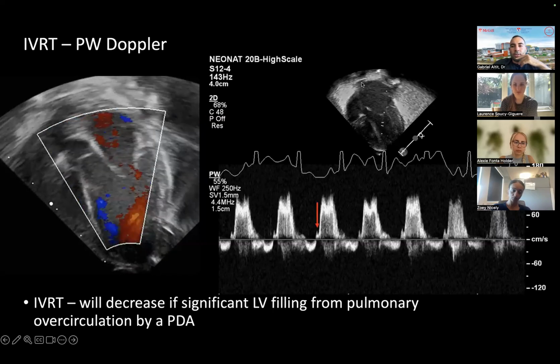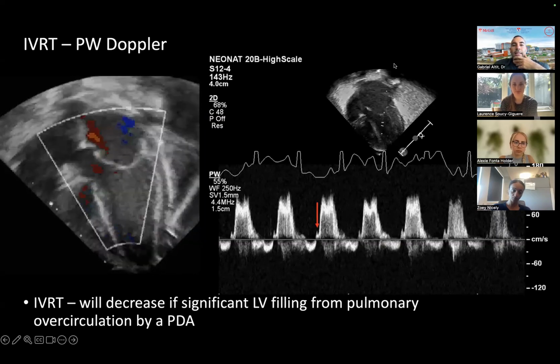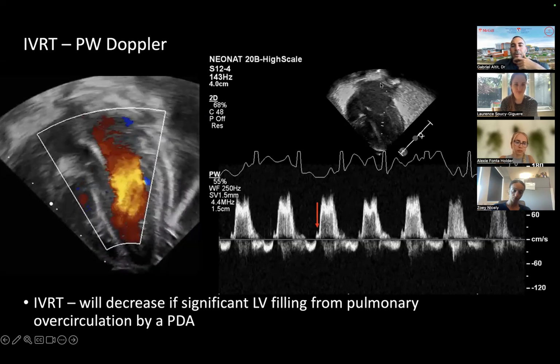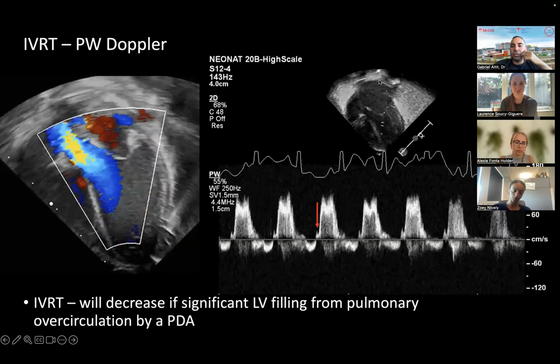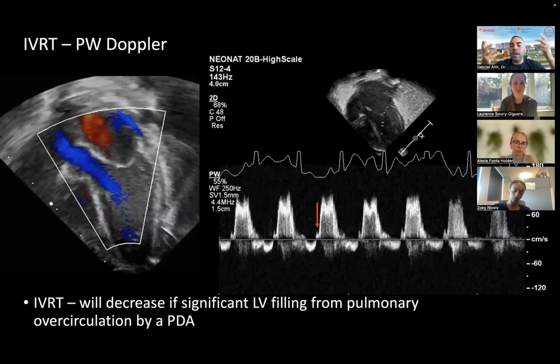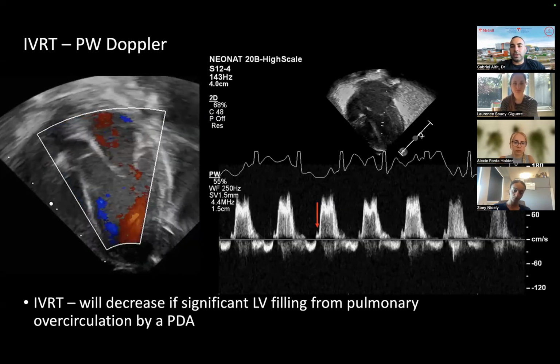This is a patient who has a particularly large left atrium. It's a kid who had, in this particular example, which is not the same as the view in color, a large left atrium, and this was a patient with a particularly large hemodynamically significant left-to-right shunt flooding that LA. Because the PVR is low compared to the SVR, there's a steal effect, and it floods the LA.